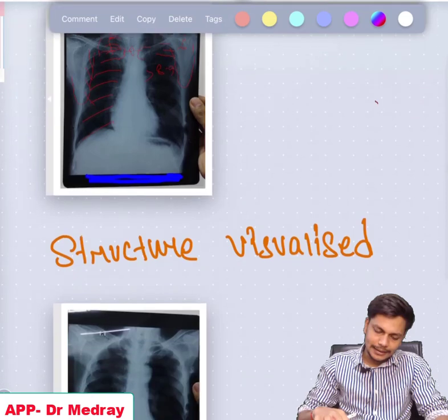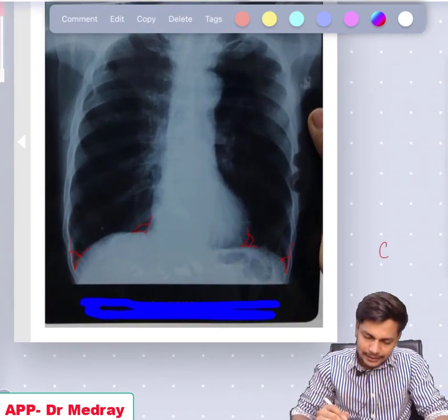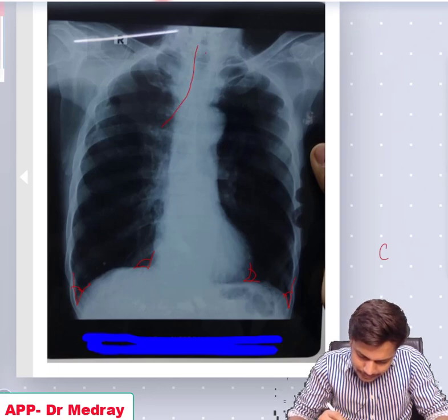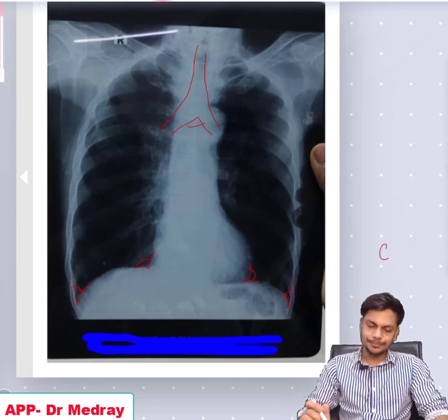In this image it is a little bit difficult to see the subcarinal angle.